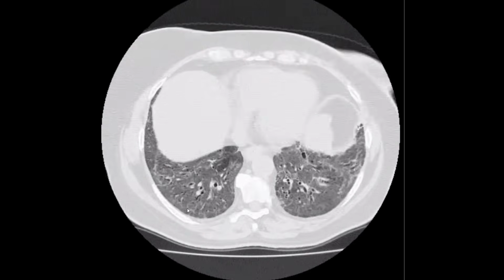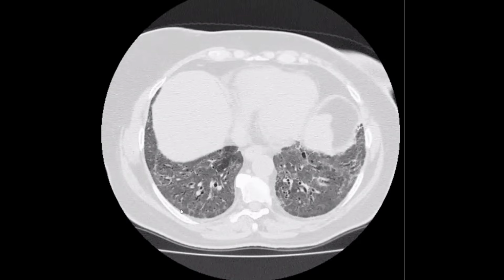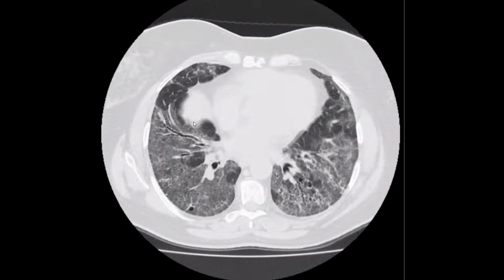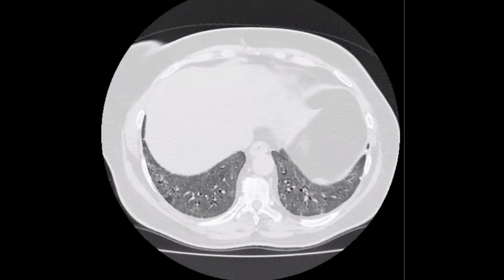So, yes. Okay, how can we reach our diagnosis? We have minimal reticulations, predominant ground glass, minimal bronchiectatic changes. If the patient is a smoker, then I could think of it, but the patient is not a smoker. Okay. No, it's not in this pattern. This would be very hilar in this area, but it's not. It will not involve the lung bases itself.